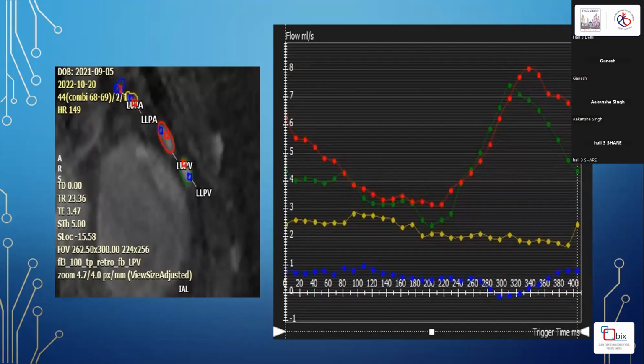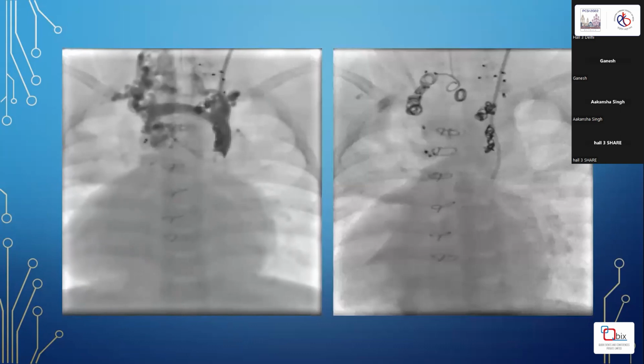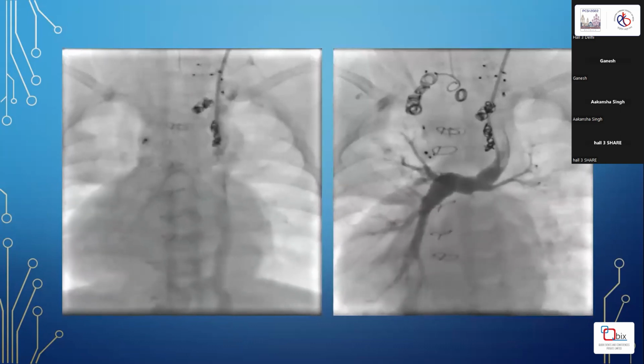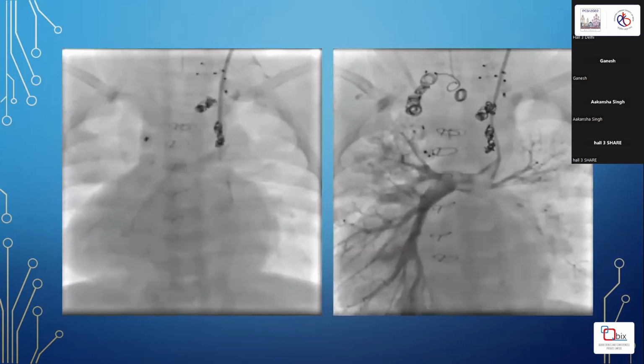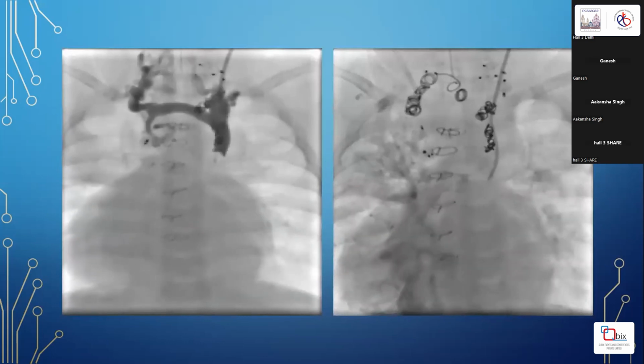And also surprisingly, they were in the same direction, which basically means that there was entirely retrograde flow in the pulmonary arteries. The cath confirmed this. Multiple venovenous and arteriopulmonary collaterals with a raised PVR, and essentially there was no flow from the Glenn to the left pulmonary circulation at all, and it was entirely collateral dependent.